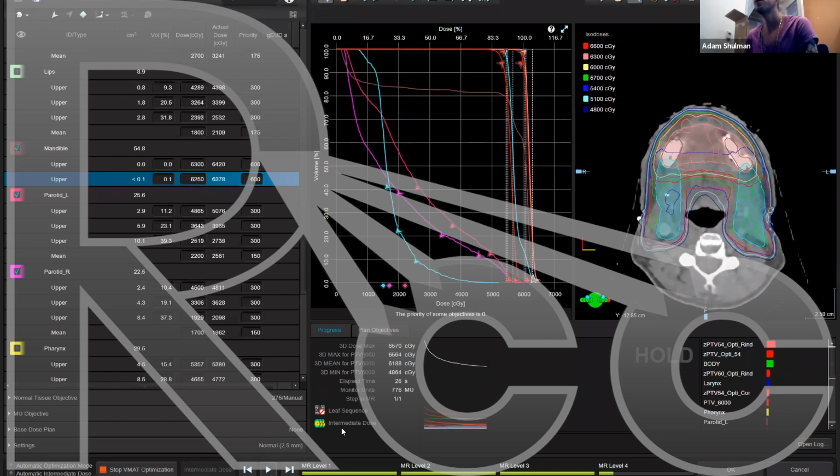I'm sorry, everyone, it went a little bit over, but I appreciate everyone for staying on just an extra 20 minutes. Dr. Shulman, do you mind if I plug a question? Yeah, sure. So if PTV is very close to the skin, do you apply any other trick or just do what you're doing as this plan?